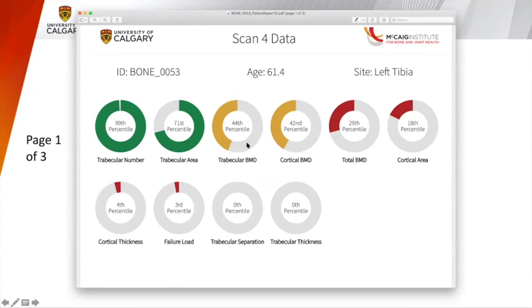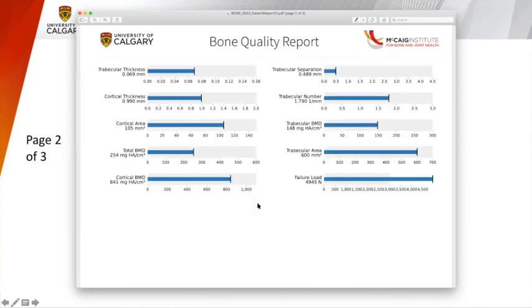And right now, we show it in terms of these circles, and the colors represent sort of the range: good is green, medium is yellow, and not doing so well is red. So it's a quick color-coded way of looking at your percentiles. To be honest, I don't think the data that I used is actually real data, so these circles aren't going to make a lot of sense. We also show the normative data in terms of these plots here, where you can see how people compare on the scale. So it's not really a percentile or anything like that, but it can be useful.